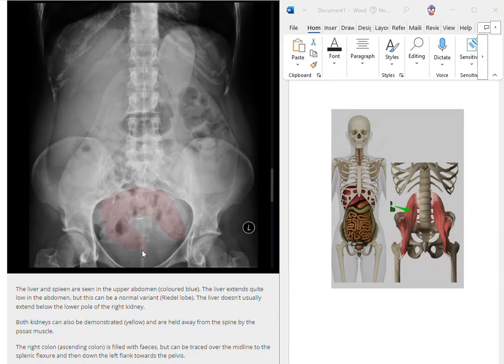All right. So we talked about the psoas muscle and the penetration with the sufficient kilovoltage power to penetrate the patient's body. We can also talk about the symphysis pubis. The symphysis pubis should be demonstrated in this x-ray because the bladder lies right there where the symphysis pubis is. So in this abdominal x-ray, we may have clipped a little bit of the bladder. We have to include all of that. So we should be seeing the symphysis pubis a little bit, but we don't.